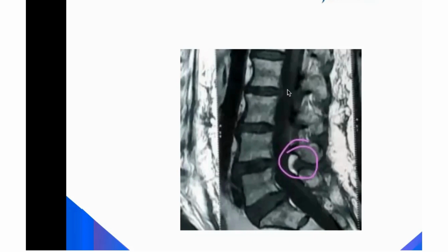So what image is this? What sequence is this? T1. T1. Even if it is a fluid, how will it look in T1? Dark. Dark. Lipoma. Right. Yes, perfect. This is lipoma. Okay, because this T1 image is epidural lipoma.